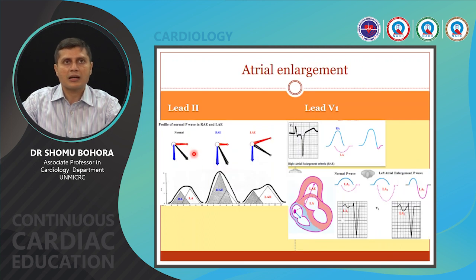So how does this occur? Understand the mechanics of it. The normal P wave consists of RA depolarization followed by LA depolarization based on the axis, and when they fuse together you get a good rounded P wave in lead 2. While in V1, the initial part, which is the RA part, is positive, while the terminal depolarization is the LA part, which is negative, and that is why you get a positive-negative P wave.